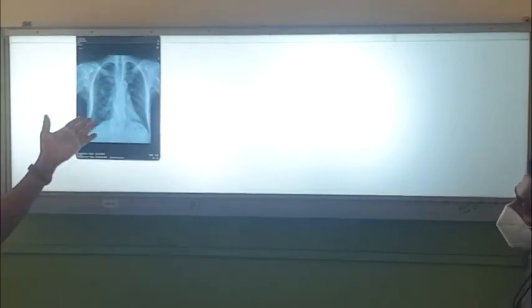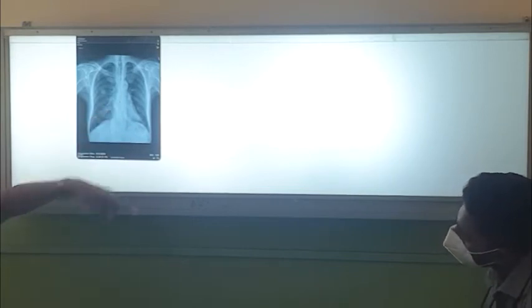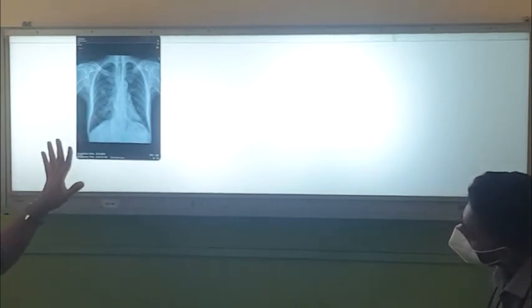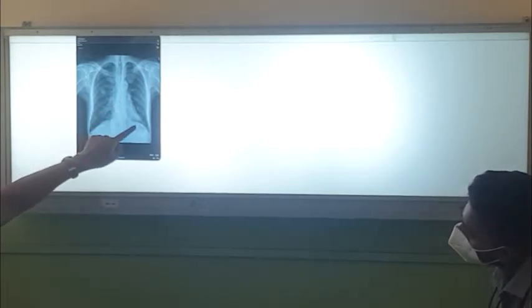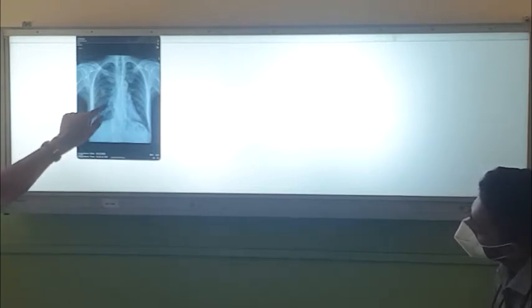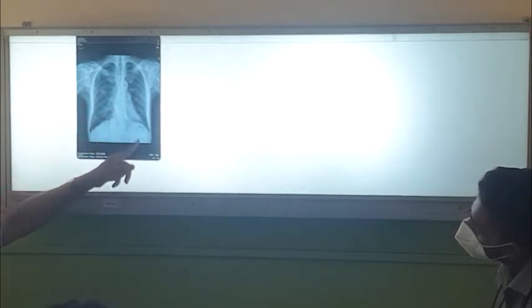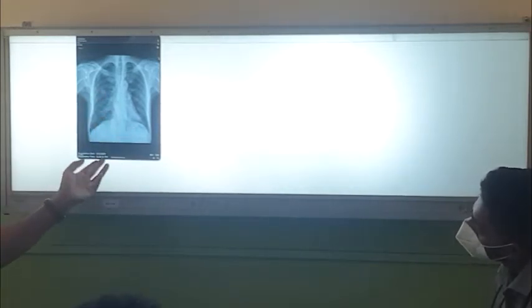This is a patient with CA esophagus who has undergone stenting. So you can get these things in your spots. This is an esophageal stent, coming with a rounded lesion, possibly a secondary. So you have to detect this esophageal stent coming with the secondary deposit there. This is how you describe it.